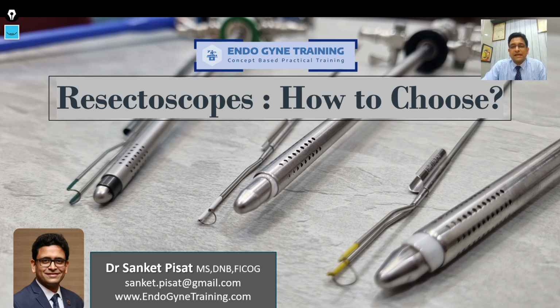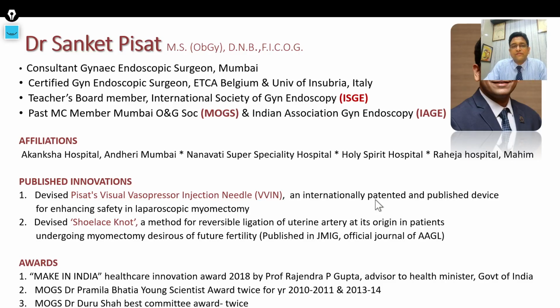It also has a massive bearing on the investment decision as to which resectoscope you must buy and which resectoscope you can buy as an additional feature to enhance your already existing skills and practice. So let's take a look at the various types of resectoscopes that we have.